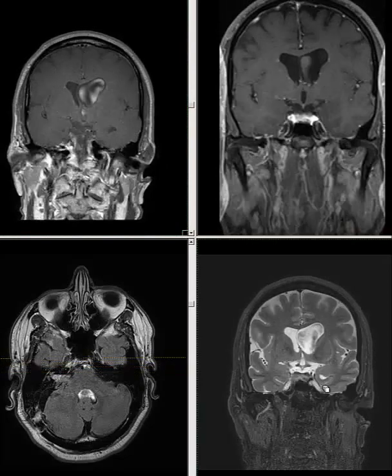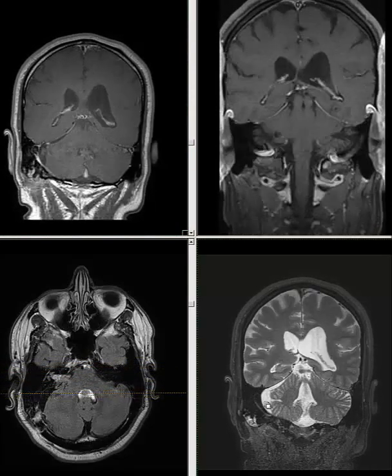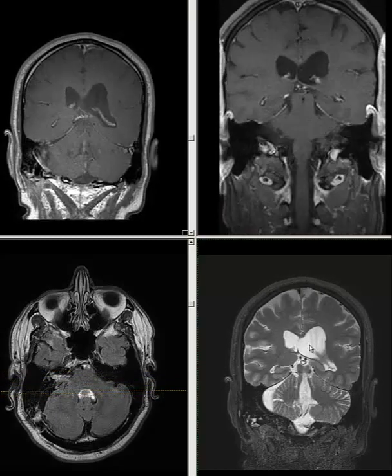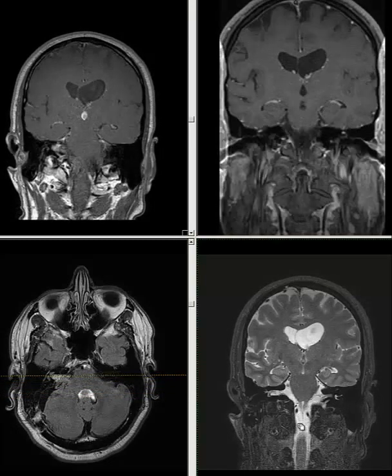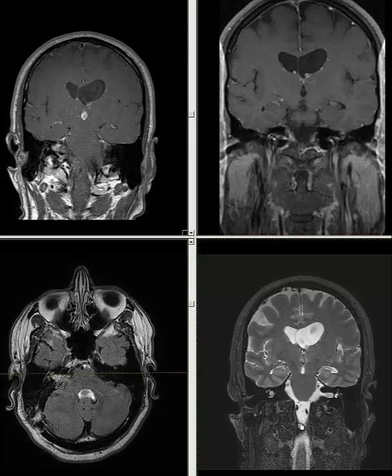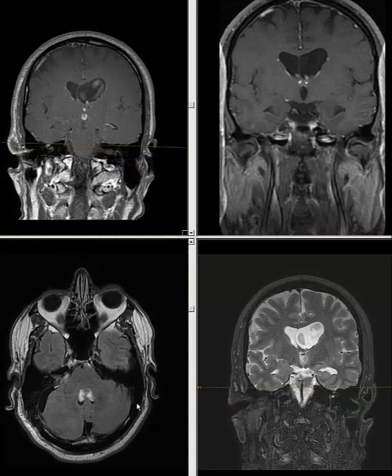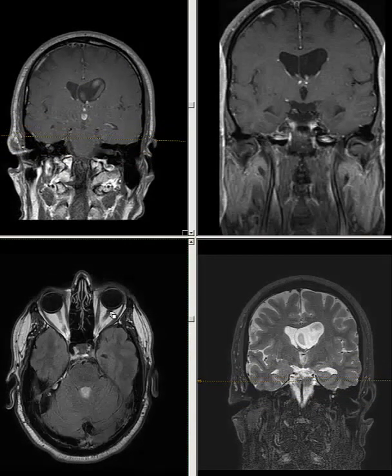So I guess the surgeon may have to either drain this fluid to relieve the pressure, or drain the lateral ventricles to drain the extra CSF out of the ventricular system. I think this is an interesting case, a companion to intracranial hypotension. This patient may have some increased CSF pressure, but I do not see intracranial hypertension yet because I do not see any nerve head indentation into the eyeball yet.